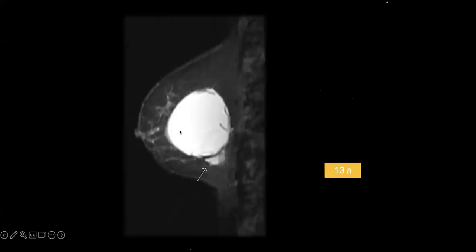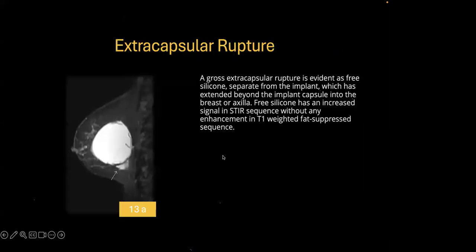Okay, now who got this one right? We were talking about intracapsular ruptures so far, and now we can see something outside the implant. So this is an extracapsular rupture. The only idea of putting this spotter is that every time you should not just focus on the intracapsular. There can be something like an extracapsular rupture over here. And there was one 13B also.